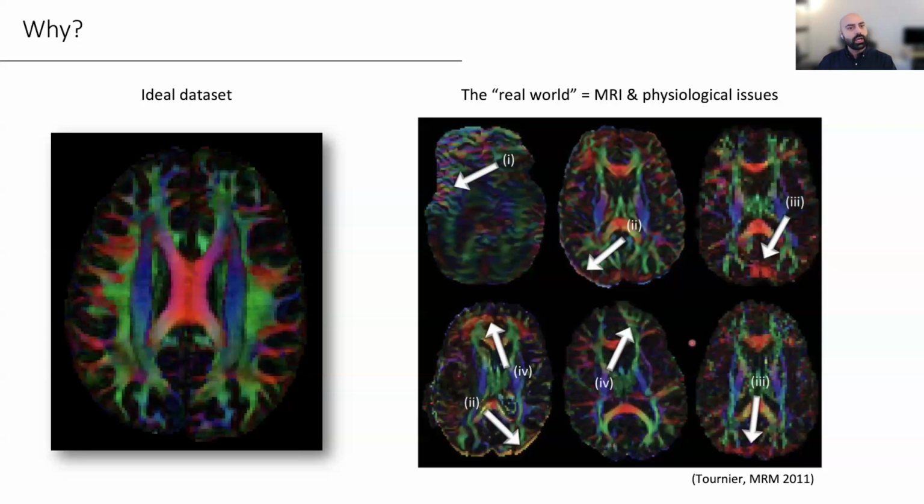These are some, I guess, more exaggerated examples in some cases, but artifacts can affect data and sometimes in very obvious ways. So these are clear examples of bad data artifacts. We can see the first example is really, really clear. But then sometimes the data artifacts can be a little more subtle. So if you just look at the outputs without scrutinizing them properly, you may miss some things.